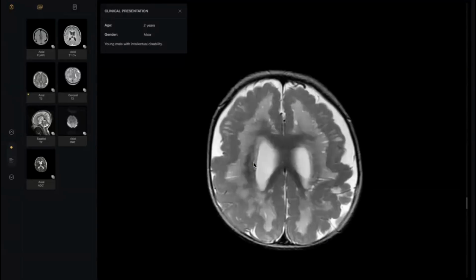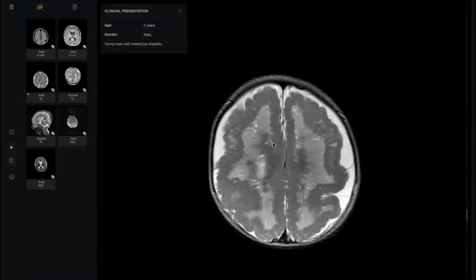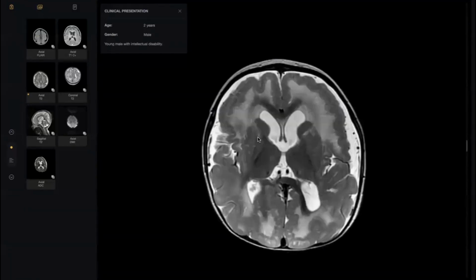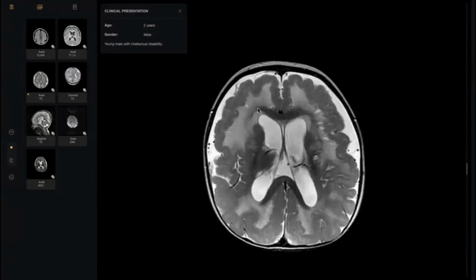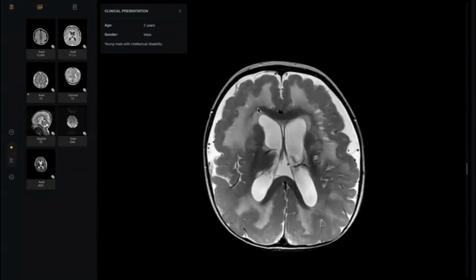You mentioned most of the findings. You can tell the examiner, for saving of time, doctor: there are bright periventricular white matter denoting leukodystrophy, associated with dilated perivascular spaces and ventriculomegaly, and sparing of the U fibers.